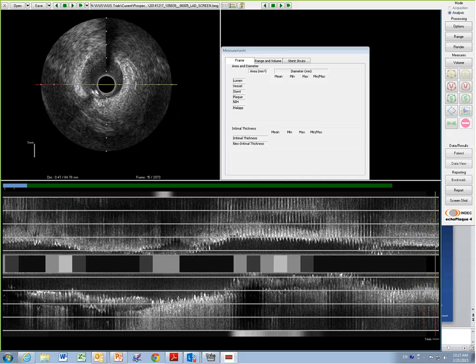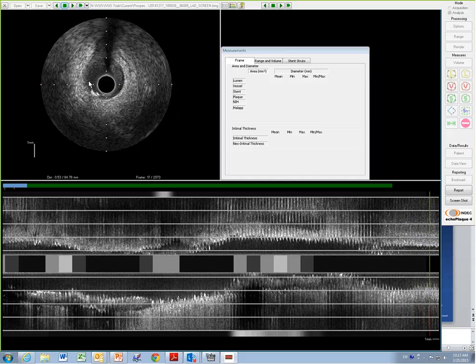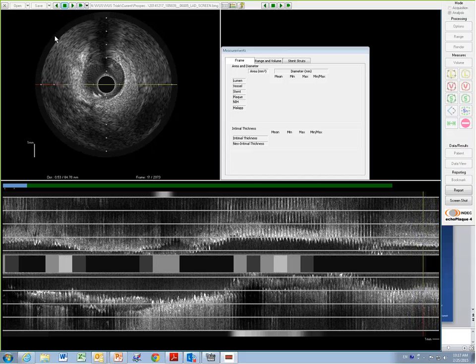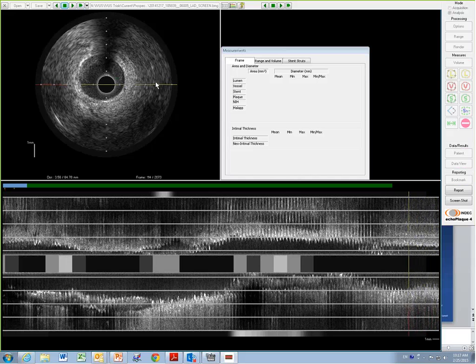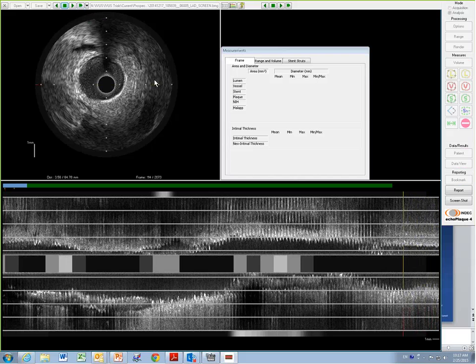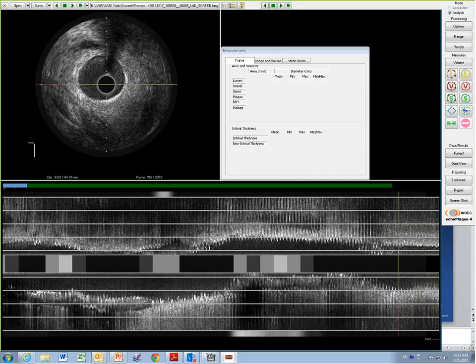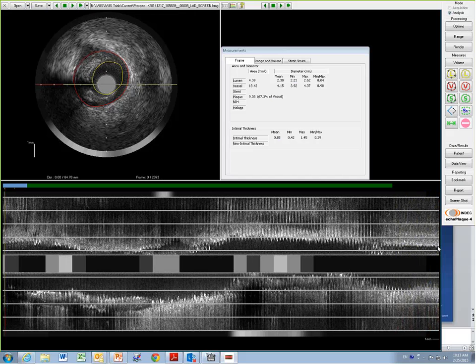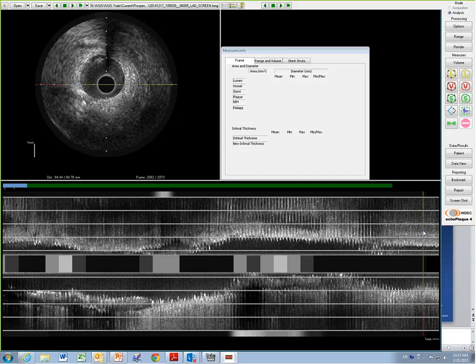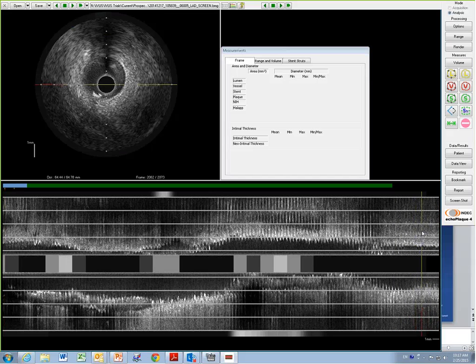One thing which is important: the quality of your picture that I see here is much better than the quality I see on my machine. This is much, much easier to recognize here. And I don't understand why, because the information is there without doubt, but it's so much easier to see it here.